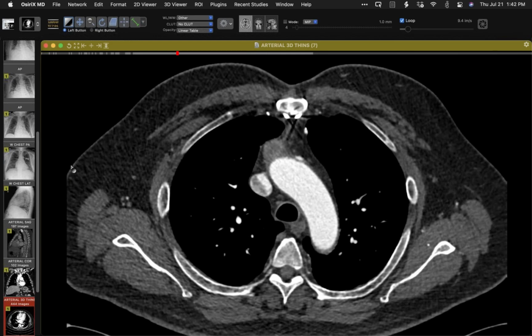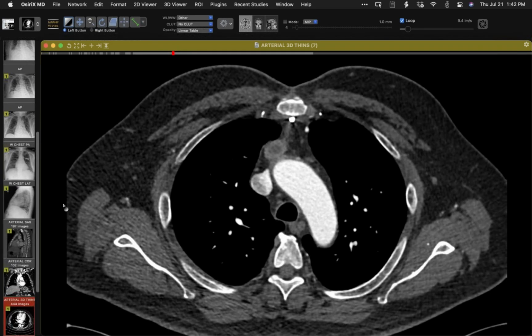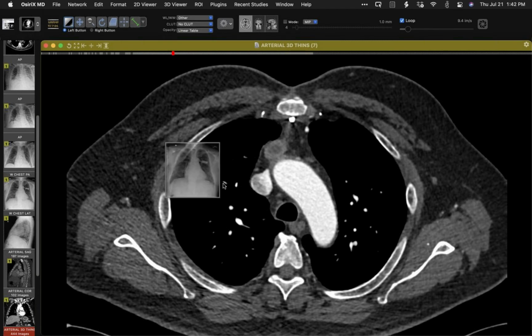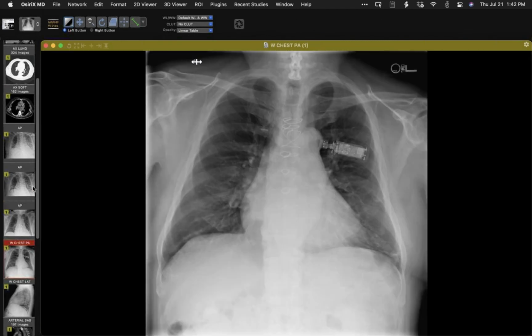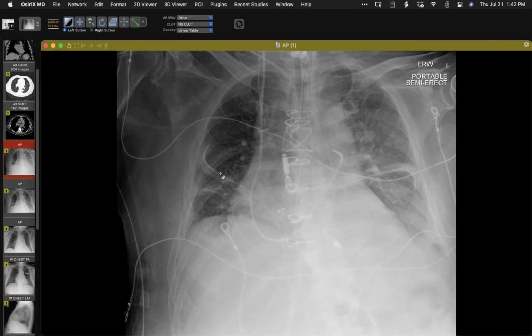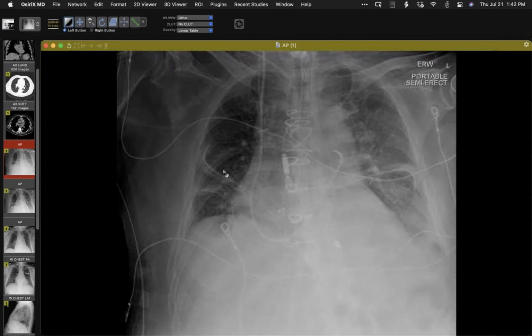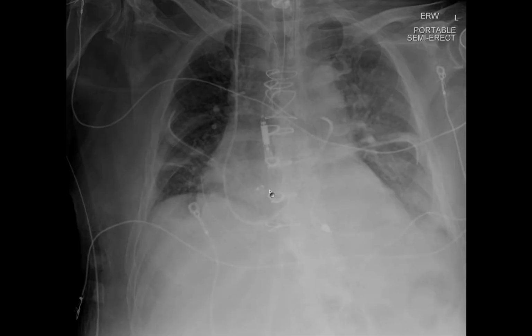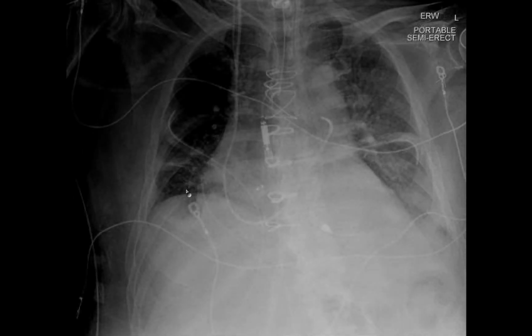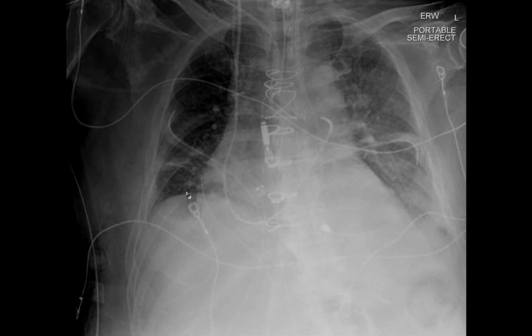So this is when going to the medical record, if you have it, is really helpful, because without that, it would be really hard. But I do want to show you some chest radiographs that were done around the time of the prior surgery. So here you can see, I'll make this big, a prior operation, intubation, pulmonary artery catheter, chest drainage tubes and the like. And there's a left ventricular impeller device.